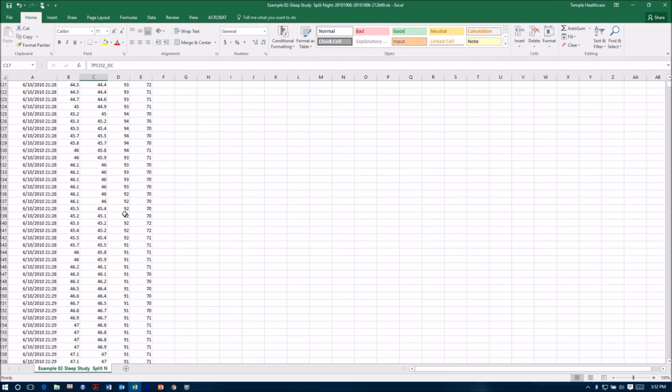So there you have it. You've got a CO2 reading, you've got the time, you've got the drift corrected CO2 reading, and you've got the SATs and the pulse rate there. Okay.